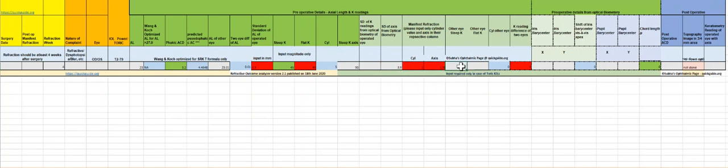So let's put a value for the other eye's steep K. So this other eye's steep K is, say, 48. So this is beyond average cutoff values. So that is why it gives you a red flag.